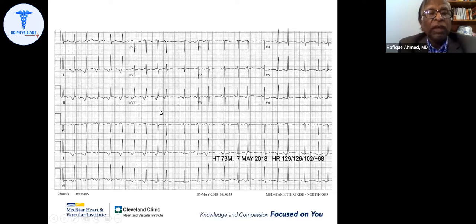So another ECG. If you see an inverted P wave in 2, 3, aVF, it's an atrial tachycardia. But what's happening here, I'm going to follow the rhythm stability. Inverted P waves come, and then it stops. Then there is a possible sinus P wave, then a premature beat.